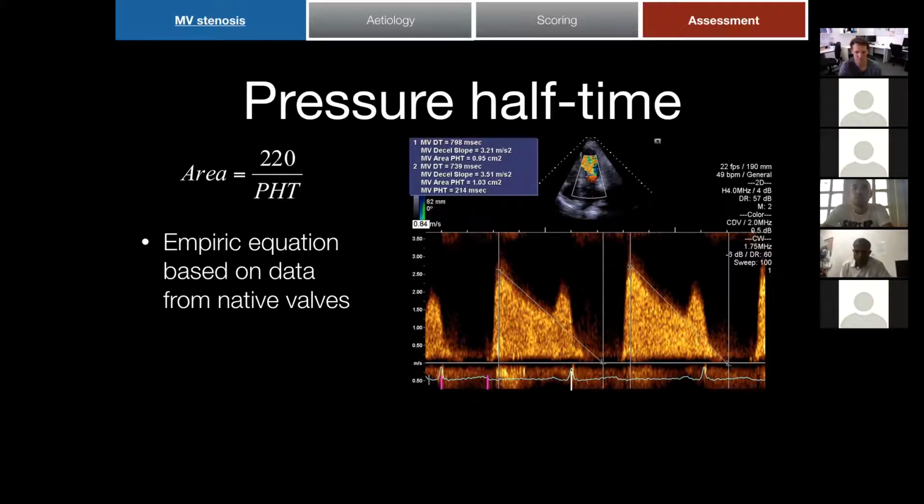I mean, that might even be, they've taken it from the peak of the E to the base of the F, really. Yep. But would you put the line maybe a little bit flatter? Yeah, nice. And the best place that they suggest is where you get the deceleration slope. The best place you're meant to do it is using that mid-diastolic slope. So you're absolutely right.